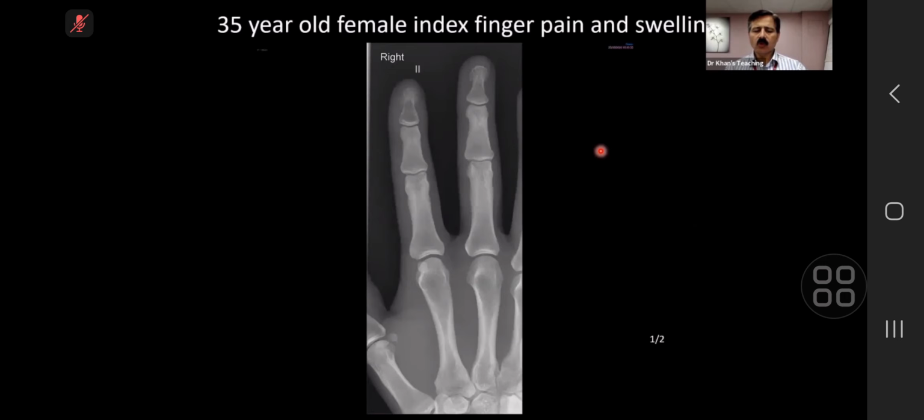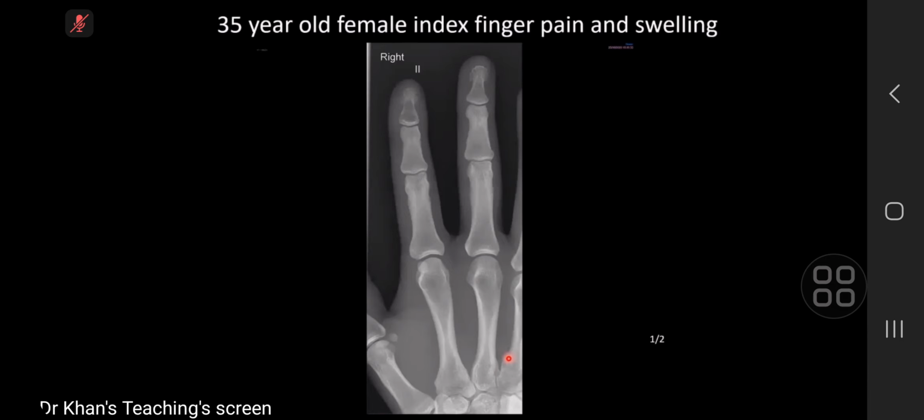Candidate 2, over to you. This is a frontal radiograph of the right index finger of a 35-year-old female patient. There is an abnormality of the right index distal phalanx, in which essentially the entire medullary cavity is occupied by a lytic lesion without particular evidence of expansion or cortical destruction, but there is a transverse lucency through the proximal aspect, suggesting a fracture through this.